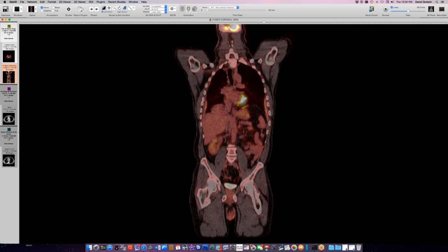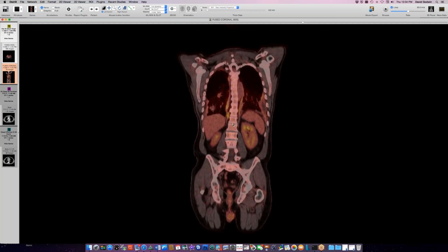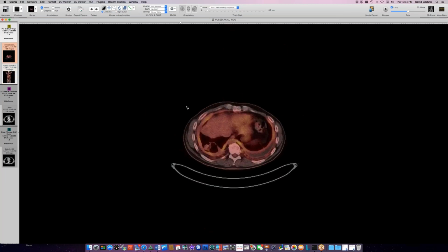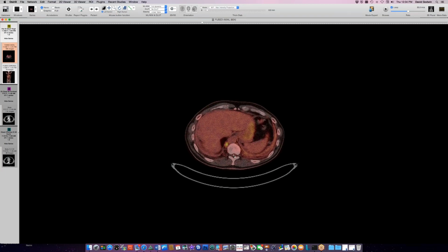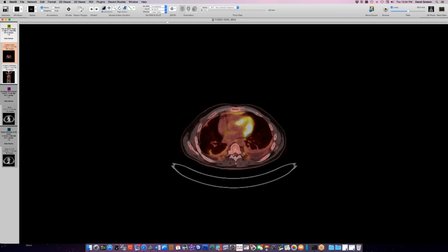It's very interesting. Quick question on nomenclature. You mentioned those little soft tissue nodules. They're extrapleural. I would call those intercostal lymph nodes. Is that a term that other people use? I don't know. Are they retrocrural? I mean, where were they on the axial? Oh, no, some of them were just along the ribs. They're even higher up than just the retrocrural. I agree, but even higher up, you see some along all the ribs, right in there. Yeah. I call those, personally, intercostal nodes. I don't know if that's correct or not. I don't know either, but since Howard mentioned them, I just thought I'd throw that out there because that's what I usually call them.